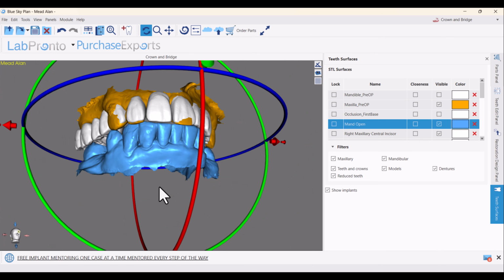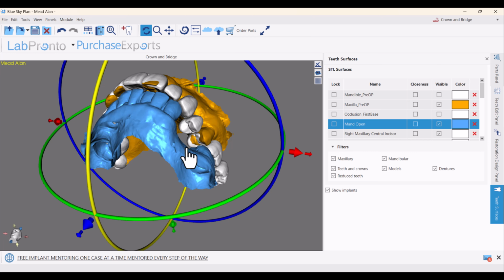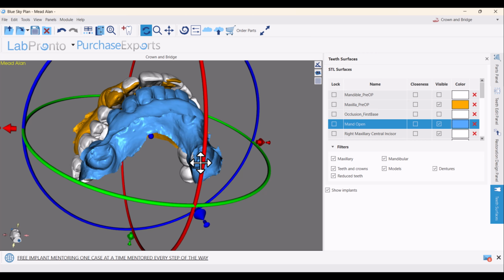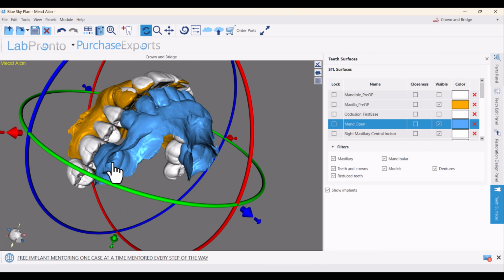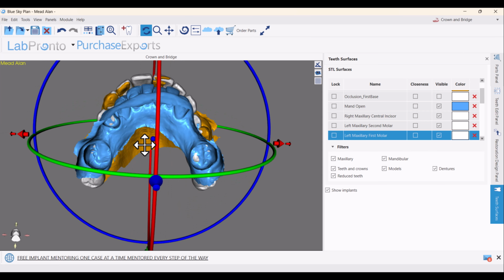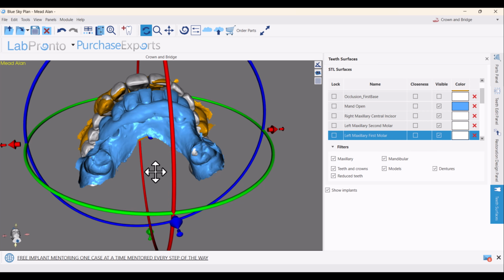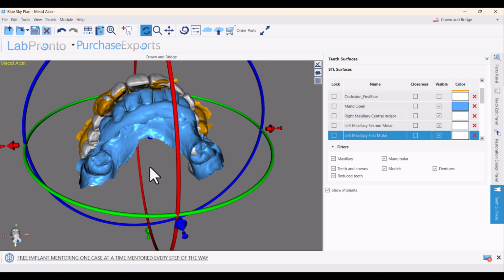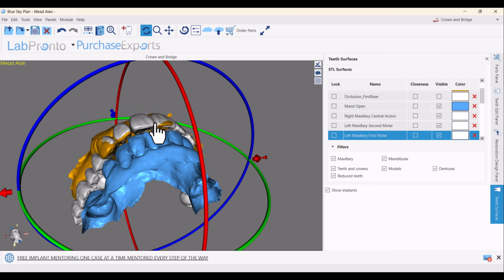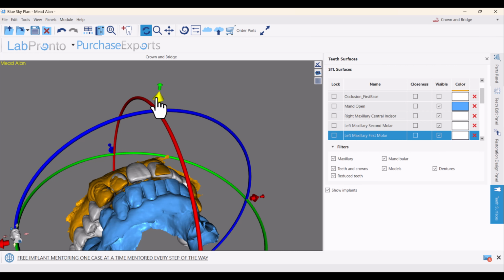Now, somebody's going to say these teeth are too big for this guy. I kind of disagree with you almost. Look at this. Look how everything's lining up really nicely right here. Especially that premolar right there. That's almost ideal. And that molar is in the right spot. So these teeth are not too big for this guy right now. And these teeth are about perfect for him. They're a little big, but I don't know. I think bigger teeth look better, honestly. I think small teeth are easier to place on an arch. Big teeth are harder to place, in my opinion at least, having done dentures for a long time.